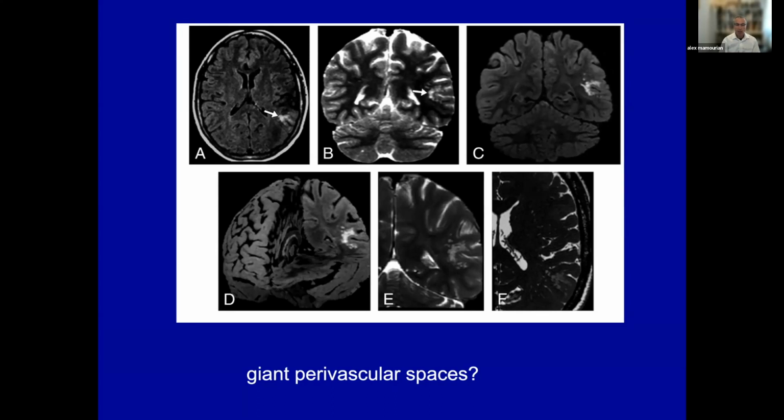We have an intermix of a fair number of very routine cases with some extraordinarily rare cases of odd diseases. And you need to be aware of the appearances of unusual diseases, because there is a tendency to accept things as all variations of common disease.